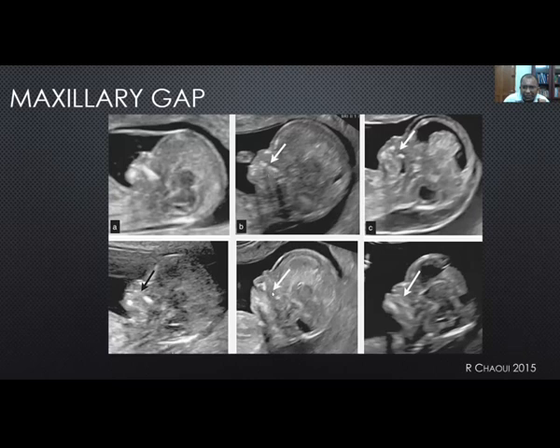And as you can see over here, with the larger the cleft, you can see an extent of micrognathia or retrognathia. Large palate clefts are associated with retrognathia, micrognathia, and also with ear abnormality. So these are things we need to seek when we have a hard palate cleft.